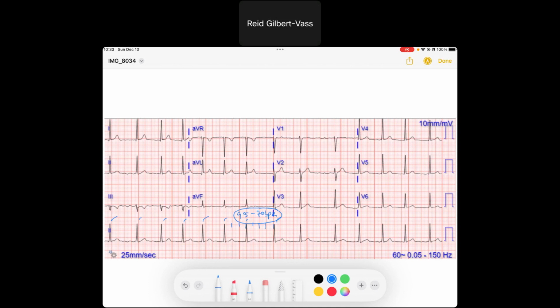Well, let's see what rhythm he's in. And you can see as I look at P waves, I don't see any good P waves. I don't see that sawtooth pattern anymore. So this is AFib. And so going back to our previous EKG, where it was hard to determine is this AFib versus a flutter, sometimes you don't really know until you slow it down. Once you slow it down, you get a better look at what the atria is doing, because that calcium channel blocker shouldn't really affect atrial depolarization very much. It just affects the AV node.